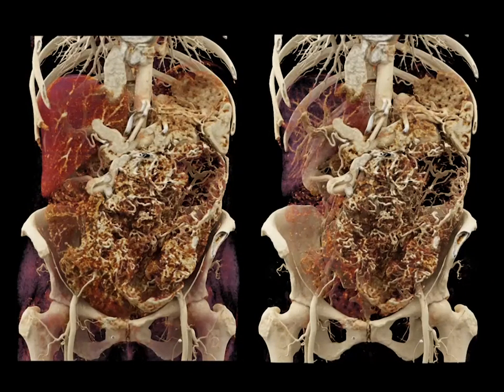So that becomes a very, very good way of thinking about how we look at things. So again, we've always done volume rendering, but now what we're saying is you need to go into things and think about it differently, and cinematic rendering proves to be very helpful in that regard. So what else can we do? We can look at small bowel obstruction, but I think let's stop right here and we'll come back and do small bowel obstruction in a few minutes.